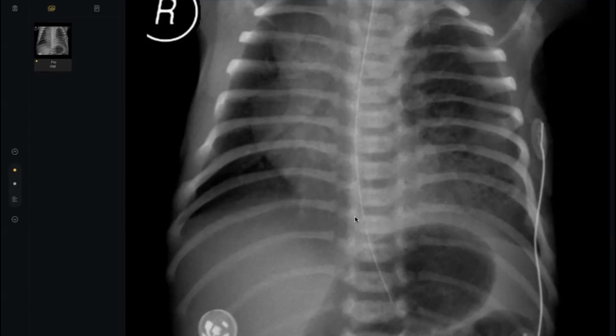So, the whole of the left hemithorax... Not the whole left hemithorax. Use the arrow and show me where is the pathology. So this one, yeah, lower lobe, left lower zone. Why? Because here it almost looks like here, but here. Okay, what happened here? Describe. There is increased opacification in the left lower zone, showing internal cystic areas.